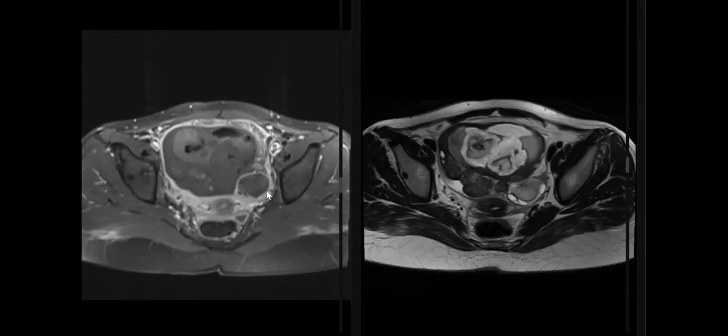We have too many findings. This is the urgent finding, but we also have another smaller dermoid. So we covered ovarian torsion, whether the ovary is torsed alone, which is common in the pediatric age group, or the ovary torsed containing a cyst or mass. And this is common for long cases.